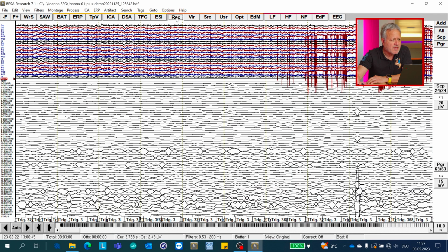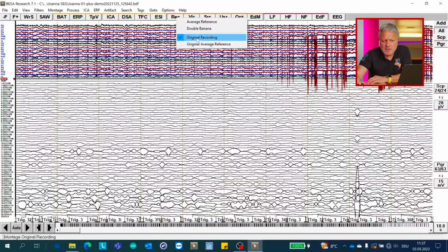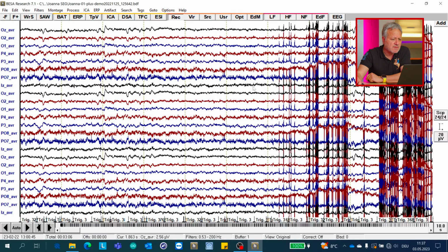Now remember, there is no montage applied to the EEG, and remember that with the Active 2, the reference is always CMS unless you change the montage. And also remember that CMS is not a really good reference. You have to take the common mode, which is 50 Hertz from the DRL, out of the EEG, and so give you the average, a different montage altogether.